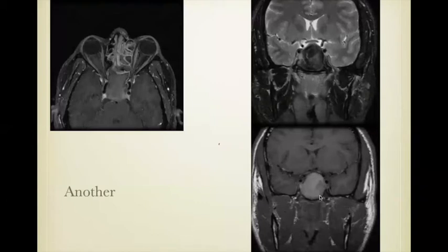That's not unusual, as you know, with chronic sinus secretions. Here it is on the T2 weighted scan. Now we know that sinus malignancies are usually dark on the T2 weighted scan, but those are ones that are not intrinsically bright on the T1 scan. And again, this can be misleading on the post-contrast imaging because we know that this lesion is intrinsically bright on the T1 study. This is another example of a marked expansion of the sphenoid sinus.